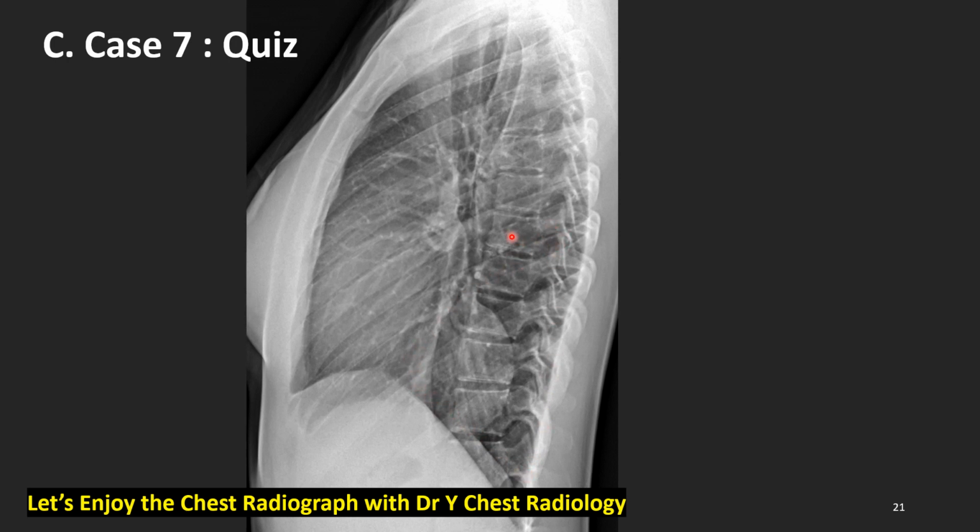Have you ever heard of the positive spine sign? The spine should be clean with spine only, not with something. That is positive spine. Something is wrong with this. Which side of the diaphragm is this? Yes, right side. Which side of the diaphragm is this? Okay, left side. The mass is in contact with the left side diaphragm. This is the inferior vena cava of the right side. It is okay. So this mass is a left lower mediastinal posterior tumor contacting the left hemidiaphragm.